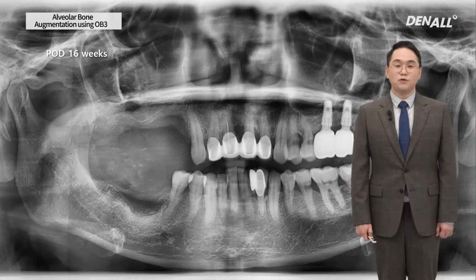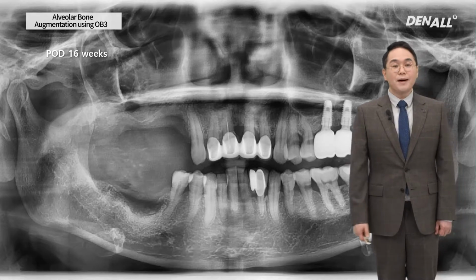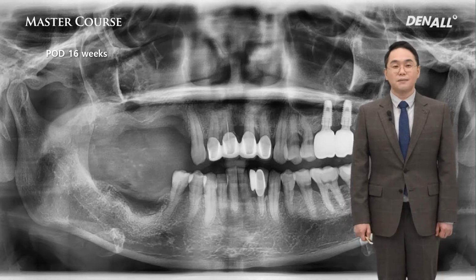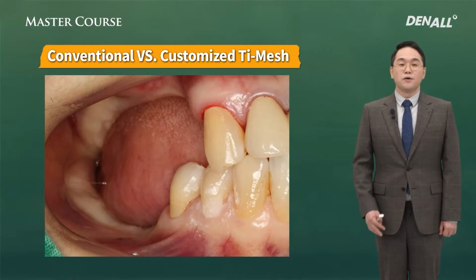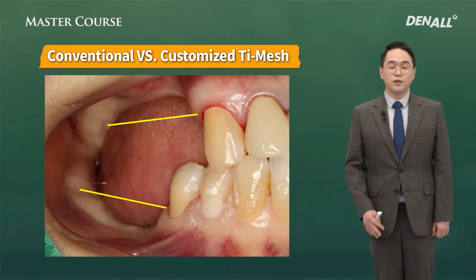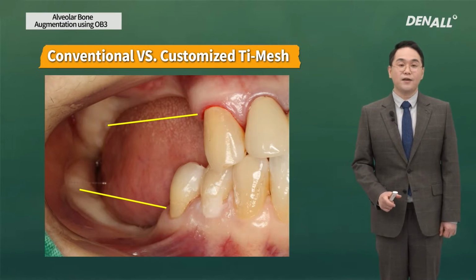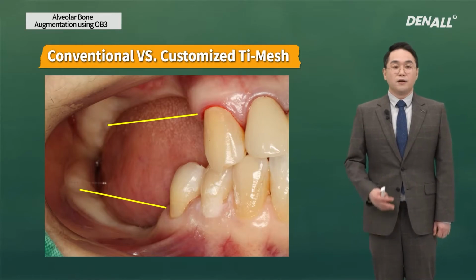Now, the right implants need to be placed according to the plan. On the panorama, the right side of the patient has vertical bone loss, but we cannot tell how much bone loss there is. If you look at here, there is a vertical wide-ranging bone defect in both quadrant 1 and 4. We need to do ideal vertical bone augmentation to come up with an ideal prosthesis. The vertical bone defect volume would be more than 3 millimeters.